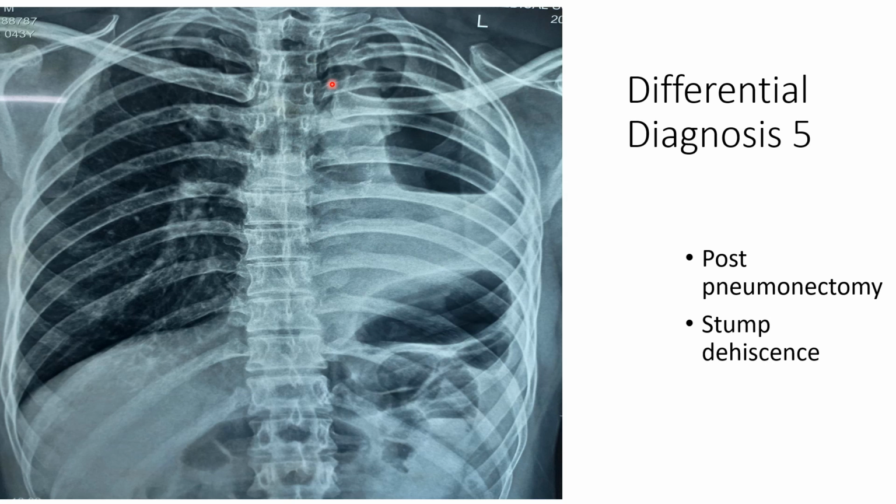So this is also an interesting X-ray. This is a rare X-ray, so you don't encounter it often. So you are seeing a straight line up here, right? So look at the lung volume. This is a larger lung volume, so this margin is up till here, right? And this trachea is slightly shifted to the opposite side, and this is the left main bronchus stump. It is ending abruptly, right?